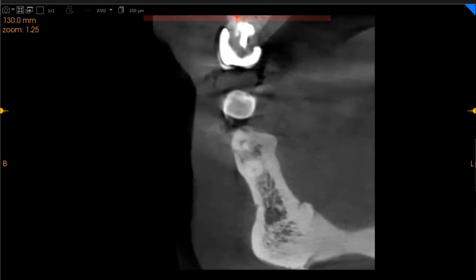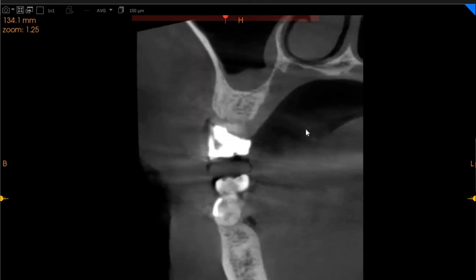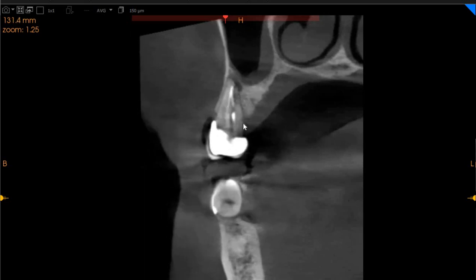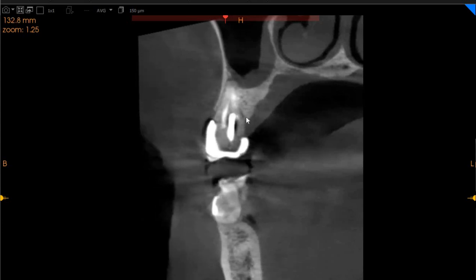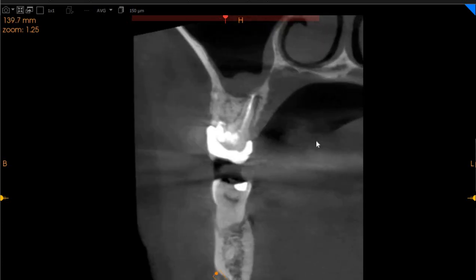When we move on to the upper left segment, the upper left segment has root canal treated teeth. Here you can see that this tooth has a periapical radiolucency. We also feel like the metallic post is resulting in a crack situation right here, which we can see. We've got a crown present here. We've got a very big core buildup material, radio-opaque material, which can be seen on the palatal aspect. But something to note is that there is definitely a radiolucency and this radio-hypodense area in the tooth, which can signify a crack in the upper left second premolar.